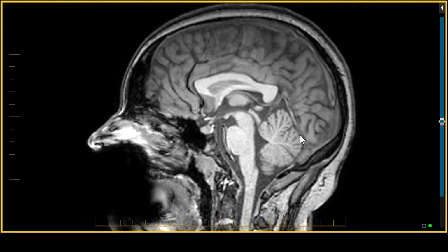I'm going to start out with a very basic approach to neuroanatomy with a sagittal FLAIR three-dimensional 1 millimeter image in the midline showing you the brain stem, the medulla with the medullary clava, the medullopontine sulcus, the pons, the midbrain, and you see the mammillary body is a nice little landmark anterior to it. There's the pituitary gland and fossa. And we're going to drill into each one of these subjects separately.